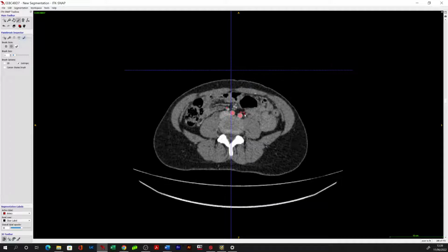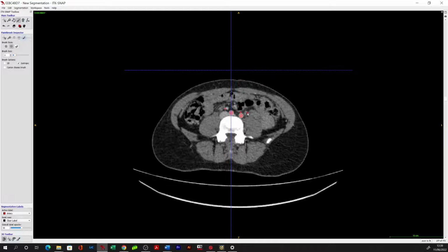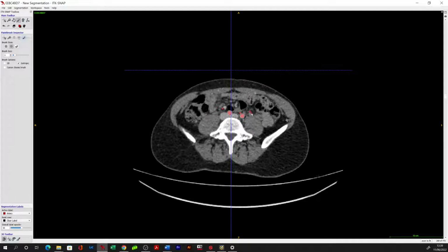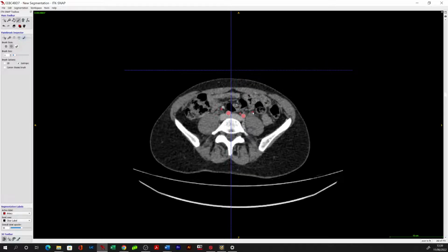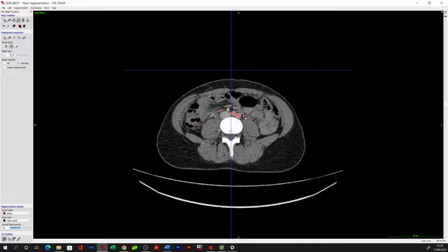Your ability to interpret CT scans for anatomical variations, which would not typically be included in the average radiology report, is significantly enhanced, because there's a fundamental difference between the scan report, which emphasizes the staging of the tumor, and our interest in the anatomical variations from a technical aspect. So this really bridges the gap between radiology and surgery.